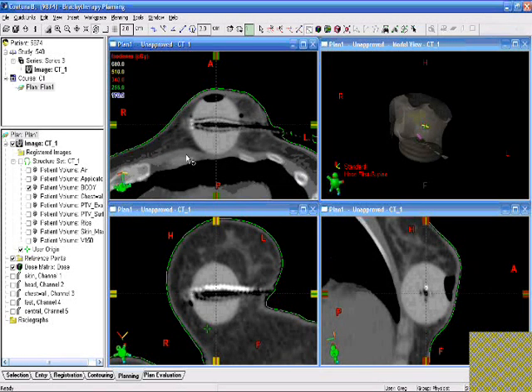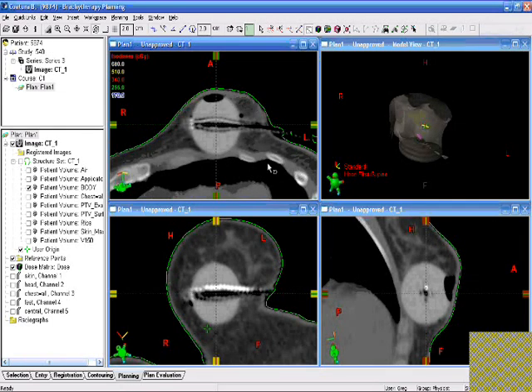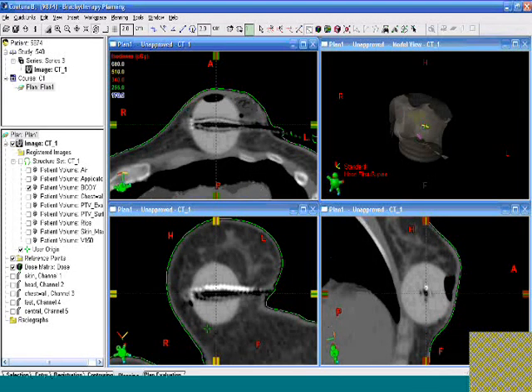In some cases, it isn't seen very well at all, and we have had some reports recently that some people have trouble picking it out at all sometimes, so you have to be aware of that. It might be useful to put in markers in more than just channel 2, maybe channel 2 and 3 with some sort of a protocol of your own so that you can distinguish those two. But we've already reconstructed all of this, so that's not too much of an issue.